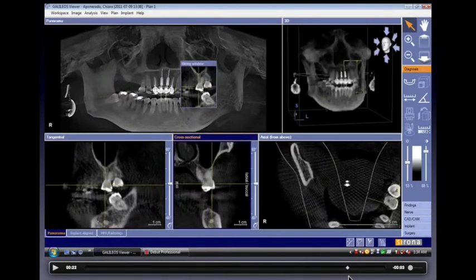Even for the maxilla, you could also see differences. You now know why on periapical radiograph your palatal apex seems to be superimposing or almost appears to be inside the sinus. Well, that's obvious because when you look at the periapical radiograph, you would see the apex overlapping the image because the floor is far more inferior than the apex of your maxillary palatal roots.